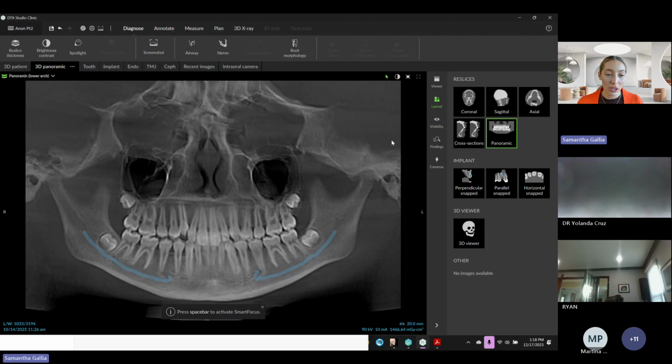If you can't see it, it's usually because trabeculation, the internal density of bone, is a really similar density to the cortex of the mandibular canal. So if you're seeing any part of the canal that's not totally a circle, it can look just like the nearby trabeculation, and it's a little confusing. Like Martina said, if there's one area where you feel like you can't see it, don't sweat it. It's more about the pattern of continuity and making sure the canal is making a continuous shape. It's not going crazy, doing something that it wouldn't be doing.